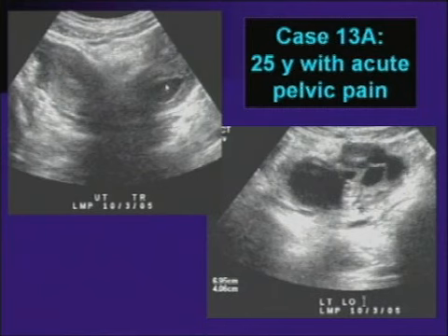In this patient, it was suspected this might represent a tubo-ovarian abscess, so the patient came to ultrasound. And on ultrasound, you can again see that there looks like there's two divergent uterine horns, has the appearance of probably either a bicornuate or unicornuate uterus with an obstructed horn, as well as this complex adnexal mass, which is suspected to partly at least represent a hydrosalpinx.